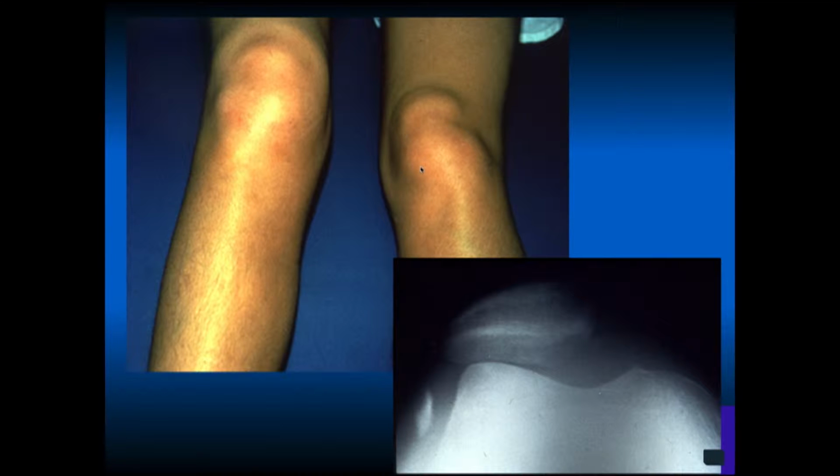So here's her normal patella, and this is a good example of how the hemarthrosis fills up way up into the suprapatellar pouch with blood. Patients oftentimes won't understand why it's way up there, but basically the capsule goes way up here and in the back, so it's like a big balloon, and the blood fills that whole balloon. So this is a massive hemarthrosis, and the number one reason for an acute massive hemarthrosis is a patellar dislocation.